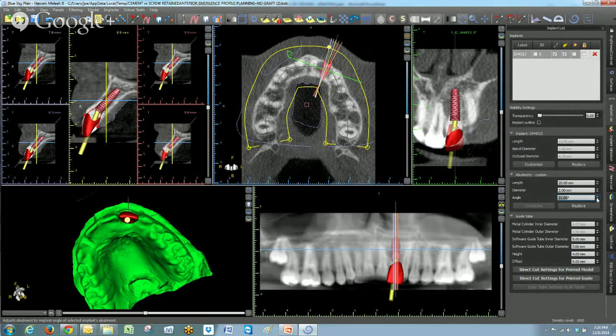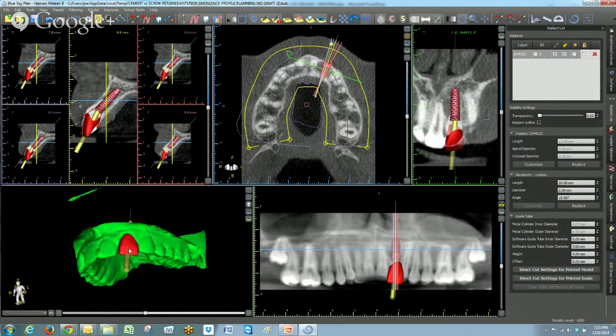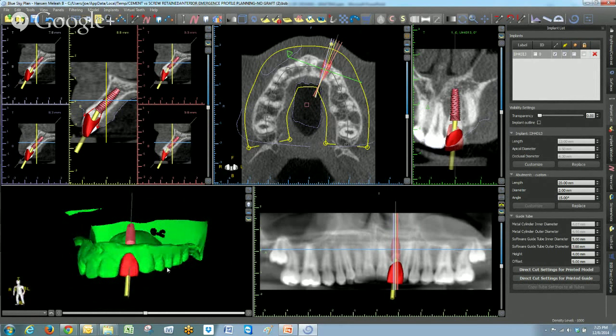So we have a 22-degree emergence on that one, and I don't like to go past 20 on angulated abutment, so I have the ability now, since I've corrected the position of it, to keep that right at the incisal edge where it should be. And now we have a 15-degree abutment, and 15 degree is a pretty common angle. Most companies sell a 15-degree abutment, and we have a good angle now to make a cement retained crown with a custom angulated abutment. But that's how I would arrive at that.